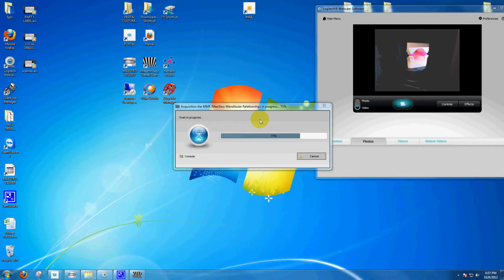The models will go through 8 acquisitions in a process of being scanned. The models turn on a single axis rotating table in 45-degree increments. And at 45 degrees, each new acquisition is being made, to a total of 8 acquisitions, which is more than adequate for any kind of work that we might want to do.